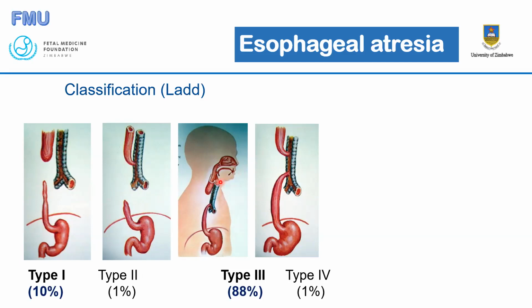You can see that there is some fistulation there. There's some fistula where there is communication with the stomach, because fluid can still go through the trachea, because remember the baby also inhales fluid into his trachea. And for this type, we may see a small stomach. But for this type where the esophagus at the top is totally feeding into the trachea, we may see a normal stomach.